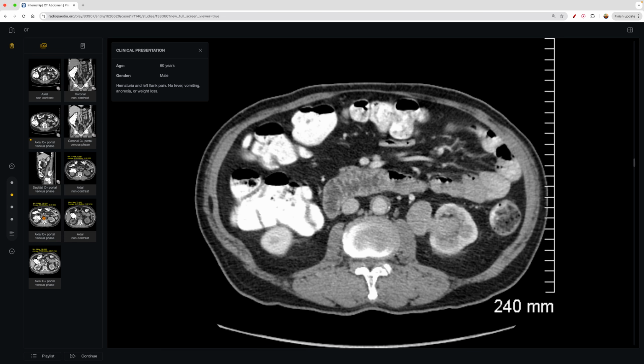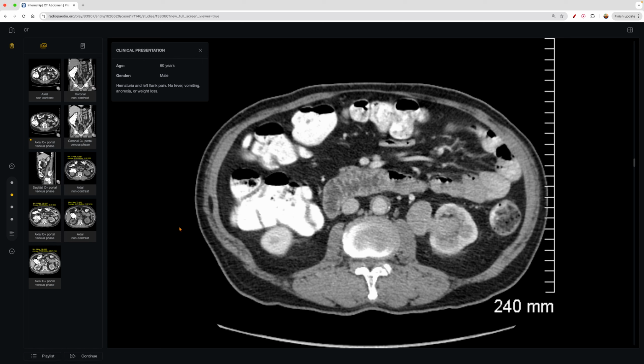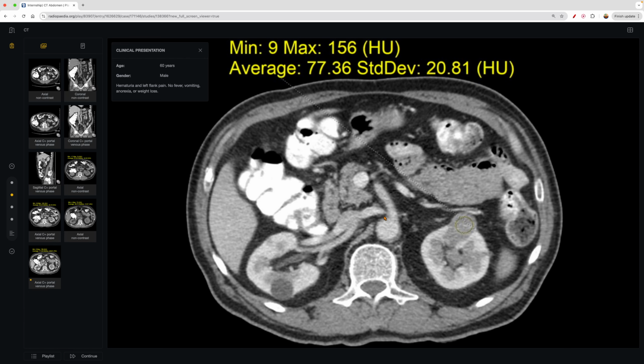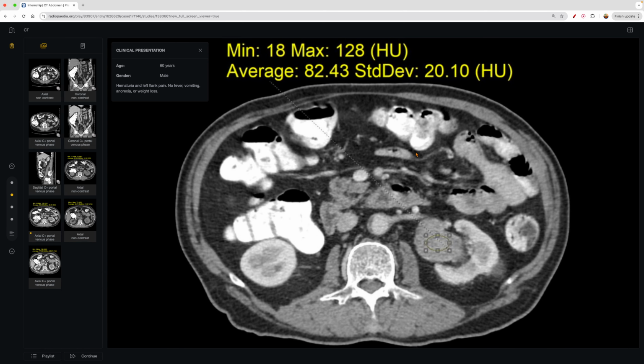So overall, the patient went on to have a biopsy, and they were found to have a cancer of the ureter here, the renal pelvis, and the renal parenchyma, the renal cortex there. You can see here some of the measurements that they were able to take, just highlighting the same ideas that were of great concern. And this is certainly important for surgical management.